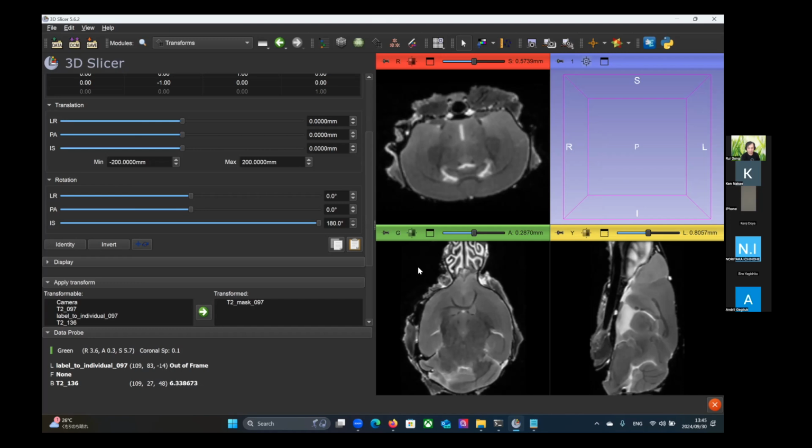So what you have to do is just rotate from mouse atlas to human atlas, but keep other things in the original way. I need to understand why sometimes this appears like this.